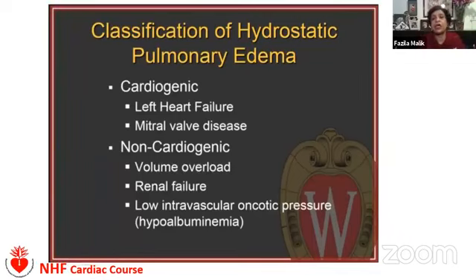of mitral stenosis. So in mitral stenosis, we get certain findings due to the enlargement of the left atrium. We get certain findings due to the enlargement of the right ventricle and the right atrium. And we also get certain features in the lung field. So we're getting some findings in the heart, and we're getting certain findings in the lungs which are happening because of pulmonary edema. So as we all know, mitral stenosis is one of the important causes of pulmonary edema.